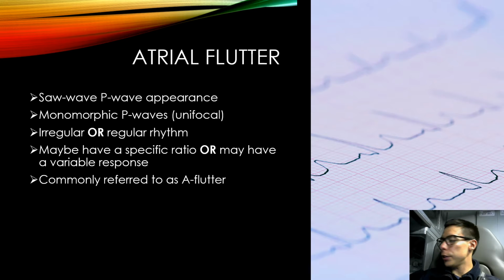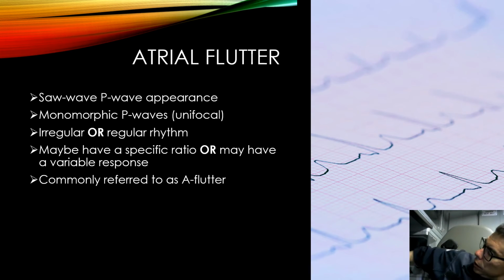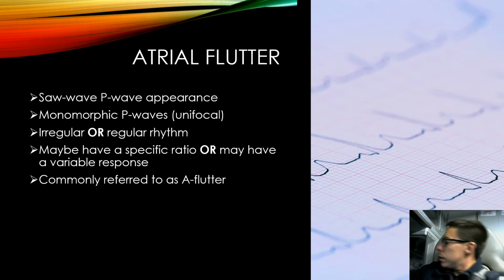All right, A flutter. So A flutter is kind of like afib, except the difference is we actually do have discernible P waves.